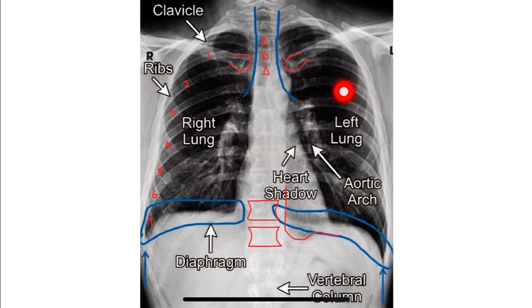Then we move to the structures involved in breathing, that are lungs and pleura. We will divide the right lung into right upper lobe, right middle lobe and right lower lobe. Here we are looking for any increase in consolidation or any increase in opacification seen in infection, pneumonia, or any mass or any abscess, or there may be signs of any calcification or any absence of the lung markings seen in pneumothorax. Now coming to the appearance of the heart.